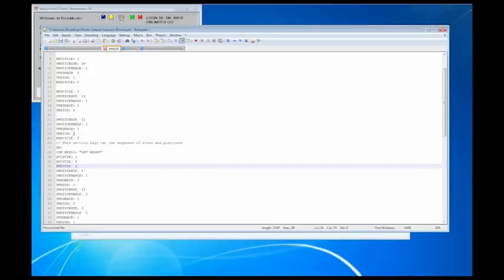It's just a way of saving yourself some time. That way you aren't constantly typing the same thing over and over. Or let's just say you wanted to mix up going at different rates, or you wanted to switch up. You didn't want to keep doing the same thing, and you wanted to basically make your own personalized thing. That's what a cycle allows you to do. So that's why cycles are very, very nice.